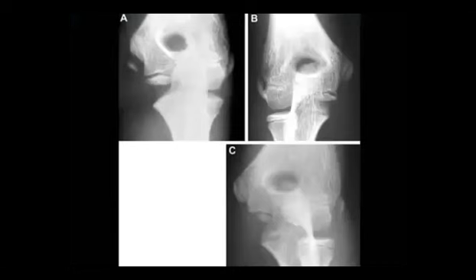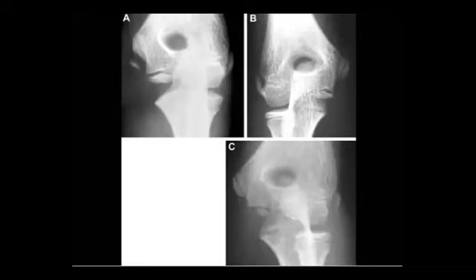We mentioned this one when we talked about the elbow, and you remember the CRITOE. So search, in order, for the capitulum, the radial head, then go to the internal, the medial, then the trochlea.